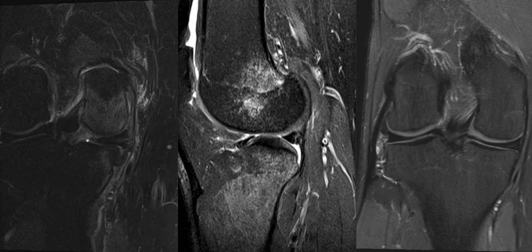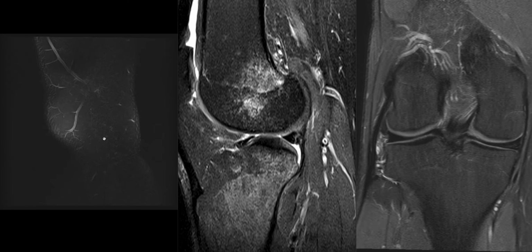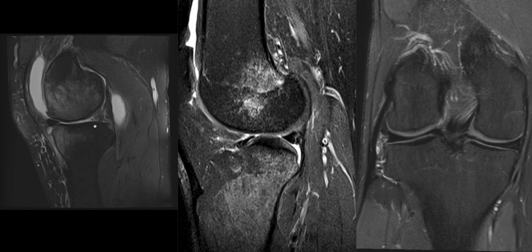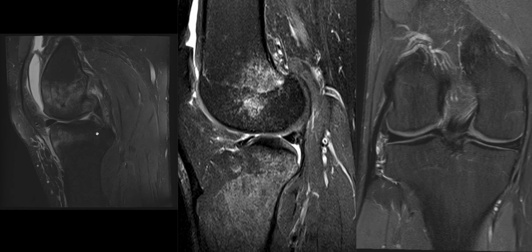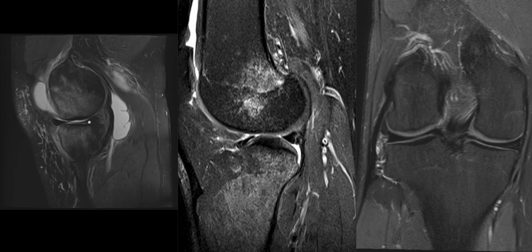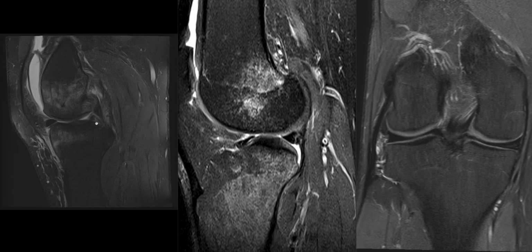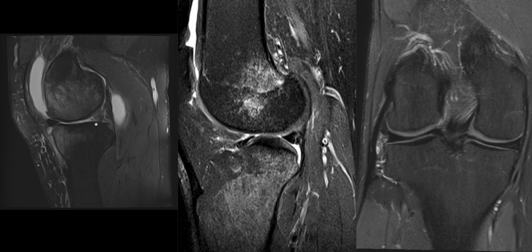So we have a cleft sign in the coronal plane with this location of the tear. And if we look in the sagittal plane, it's not surprising that we see the ghost sign in this plane. We can see that the meniscus is normal to here, and as we scroll centrally, it disappears, giving us this ghost sign. So there are three descriptions: horizontal, longitudinal, and radial.